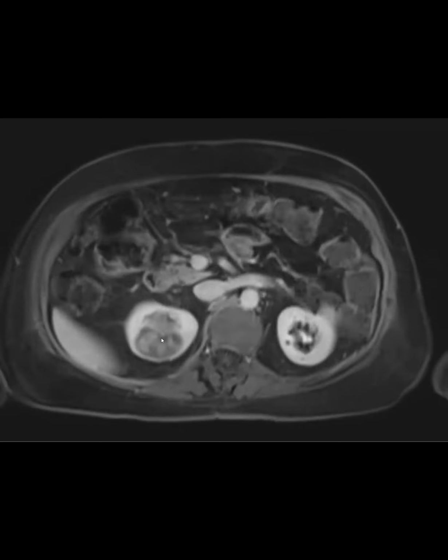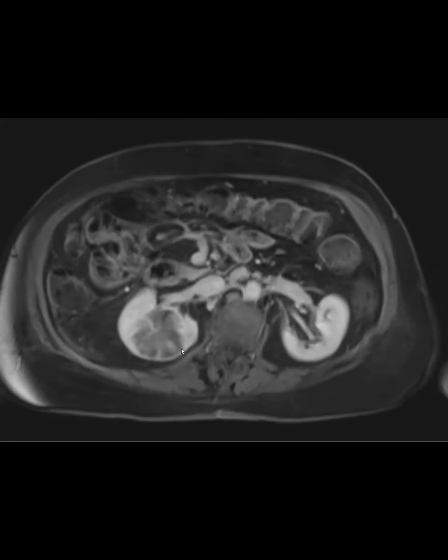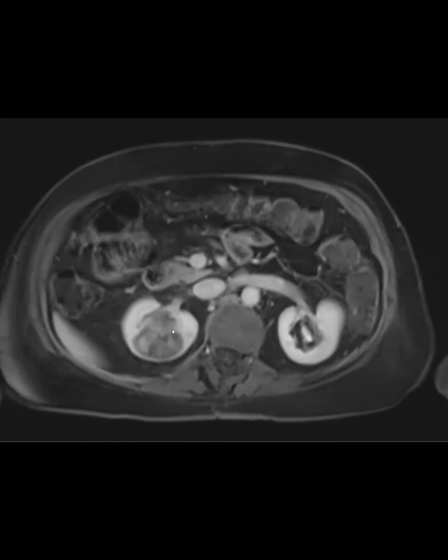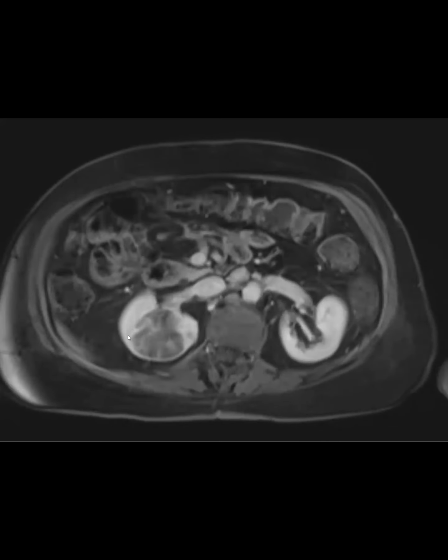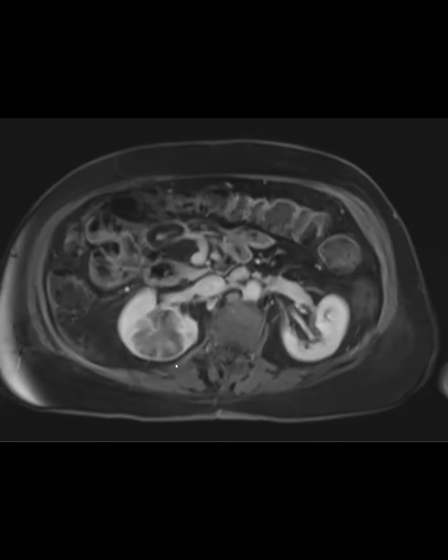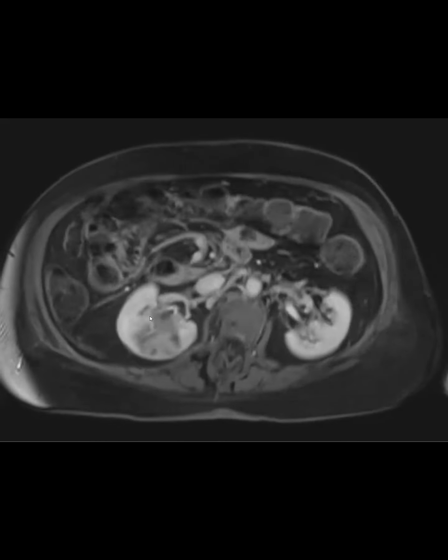The other thing is that they call it a ball or a bean. RCCs tend to arise in the cortex and grow like a circle, like a ball. They can be endophytic or exophytic, but they usually are a fairly well-defined ball. Whereas a urothelial tends to maintain the renal contour, the bean shape of the kidney. This one looks like it's maintaining the shape, infiltrating into the parenchyma, but it's not a well-defined rounded mass that arose in the cortex. This was biopsied through ureteroscopy and was a urothelial cancer.